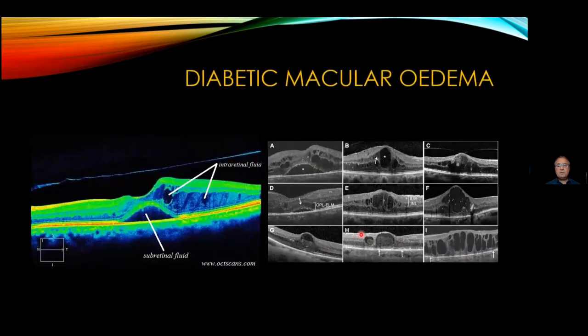So these images that we've got there are, as the heading says, of macular edema that is due to diabetes. So as you can see, a variety of different images and pictures that you would see. Now, very important is the longer that these patients have this macular edema, the more damage they will have. So that is subretinal fluid, intraretinal fluid. There's some intraretinal hemorrhages with those white spots that's there, and then also some blood clots that's inside these cystic spaces.